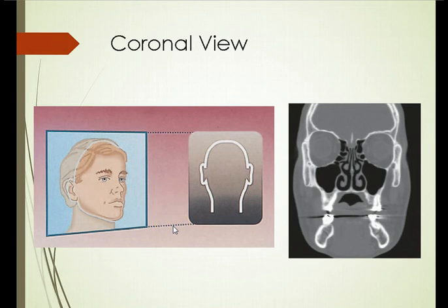Now, since we went over the CT scan, talked about different tools to use for evaluation, magnification, changing of the contrast, we also learned how to trace the inferior alveolar nerve, and just the concept of how the layers work, how to see the cross section.